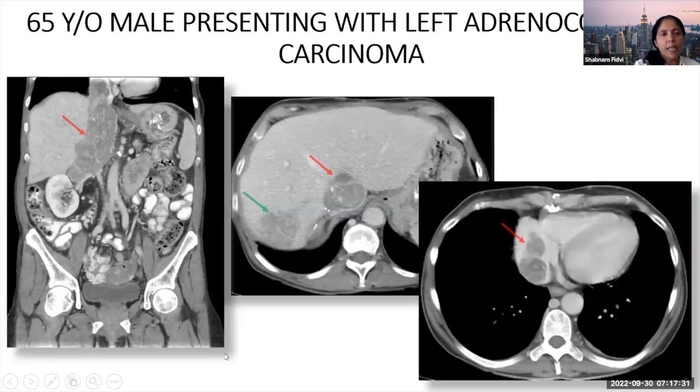This is the same patient at this point. This is a follow-up. He's undergone a left adrenalectomy in the interim, and unfortunately for him, still has pretty large expanding enhancing thrombus within the intrahepatic IVC, this time extending into the suprahepatic IVC and the right atrium. And he also has developed a hepatic metastatic focus within segment 7 on this follow-up.